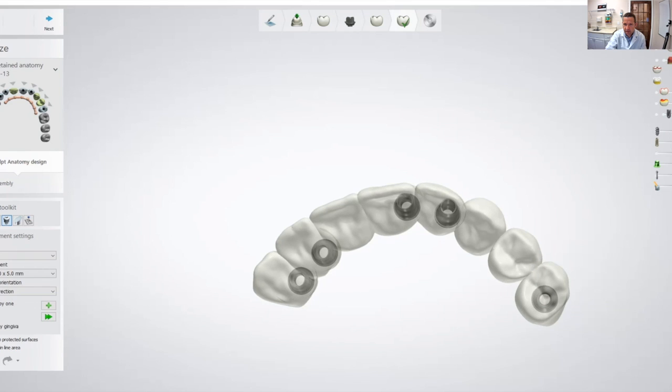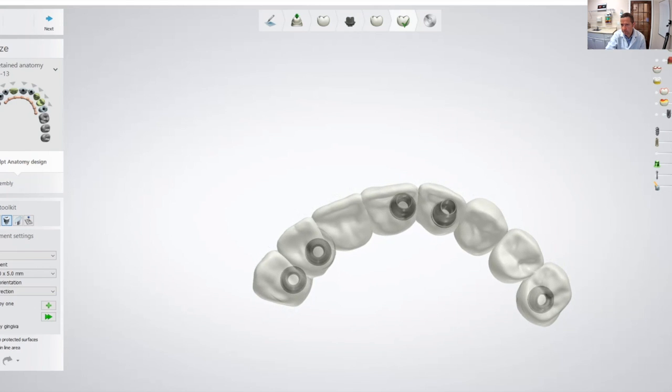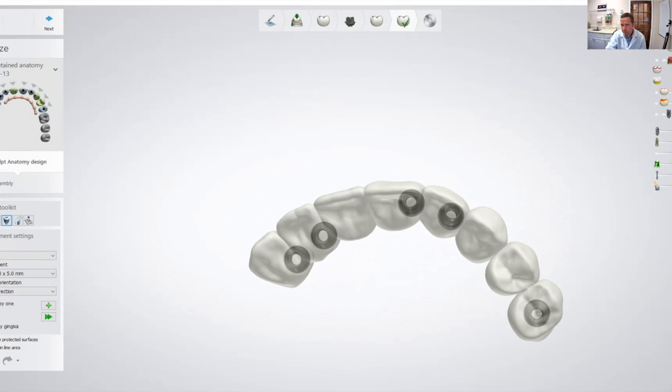These copings that I'm using are angulated screw channels, so they use screws where the screwdriver can be inserted in an angulated position. So I have like 20 degrees that I can work with. I like to bring it to the occlusal surface of the tooth, or the lingual fossa if it's anterior.